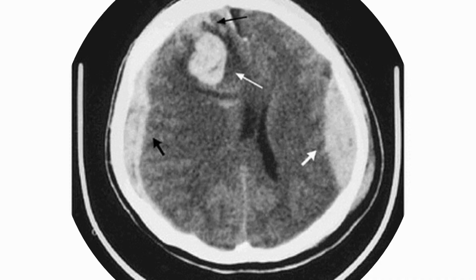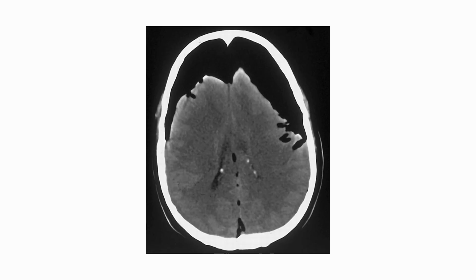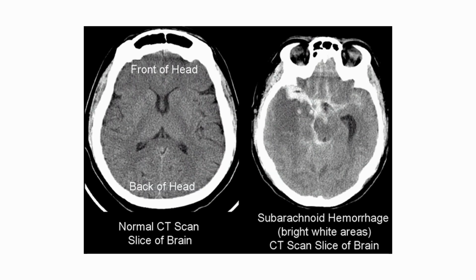Subdural is usually common in elderly people, and they may live normally with it because they have enough space in the cranial cavity for the blood to clot and stay there. Sometimes they may come with recurrent falls, and they may have an acute on chronic subdural. This is the Mount Fuji sign. Pneumoencephalus is present, and it's the Mount Fuji sign.